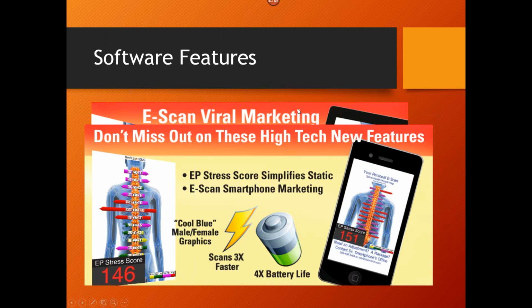Now, the new features in the software, a couple of things in addition to the EP stress score. There's a whole bunch of new features, a bunch of improvements even to eScan. But the graphics, obviously, we have male-female graphics now, which are really cool. The scan times have been reduced. I changed the algorithm for auto-scan, so it's significantly faster.